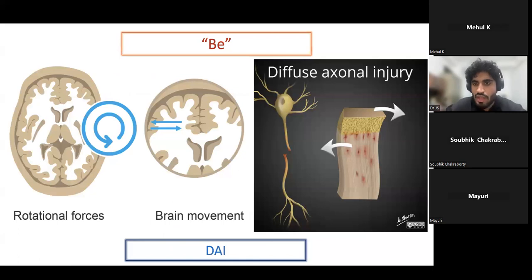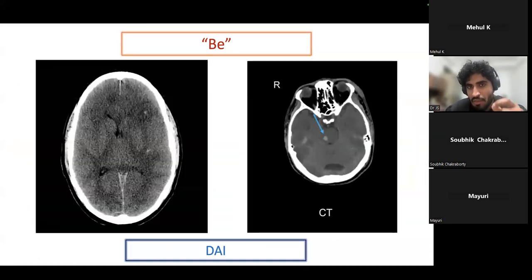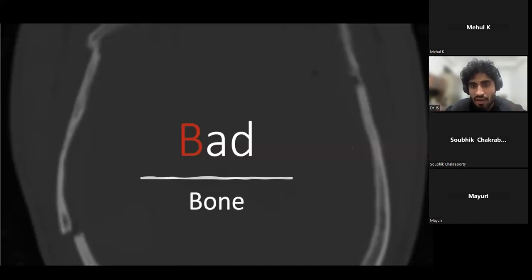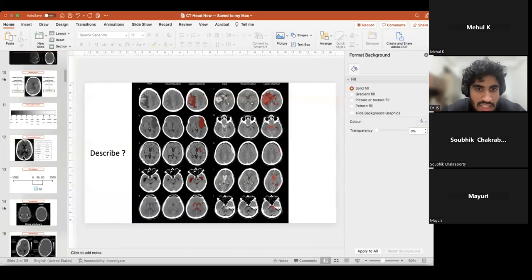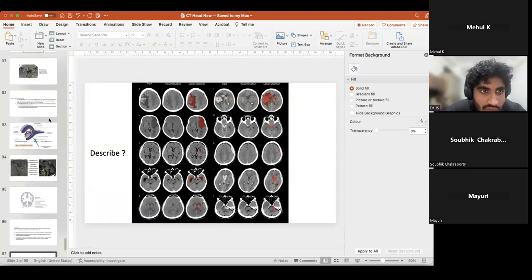Okay, then there is a diagnosis called diffuse axonal injury, where because of shearing force there can be multiple dot-like contusions that can be appreciated in CT, and it is not that sensitive. Usually we go ahead with the MRI. Other than that, what are the other things we look at in CT? Can you see this part here? Can you see this? Anyone?